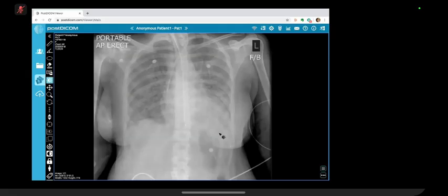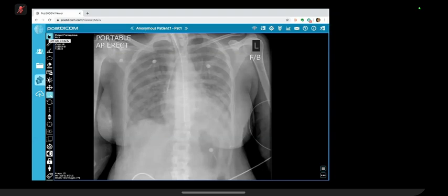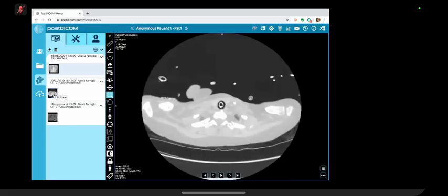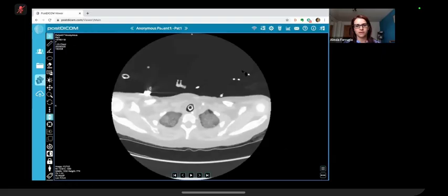So with the history, I will be thinking along the lines of an infectious process, given the transplant history. I would like to know about the immune status of the patient, if there is evidence of immunosuppression. Yes, she is heavily immunosuppressed. So with that history, my first differential would be a PCP, which is known as PJP now in the current context, and I will do a CT to evaluate the pattern further. Well done. Let's have a look. She's now intubated.